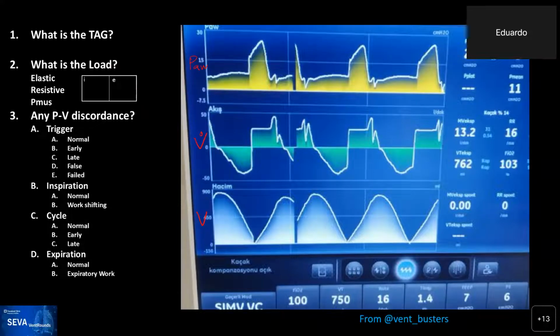All right, I see it's going to be challenging for me to see the tag. Oh, there you go. Somebody put it in. Thank you. So Ryan wrote, a couple of team members already came down recognizing this as volume control. So absolutely, this is volume control. And we know that because the flow is controlled.